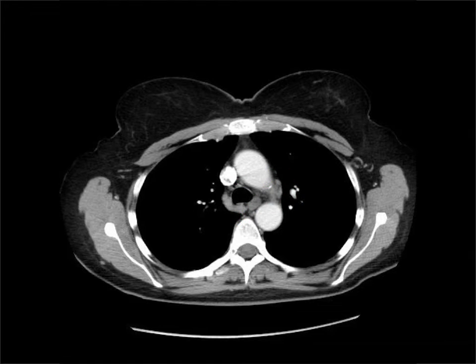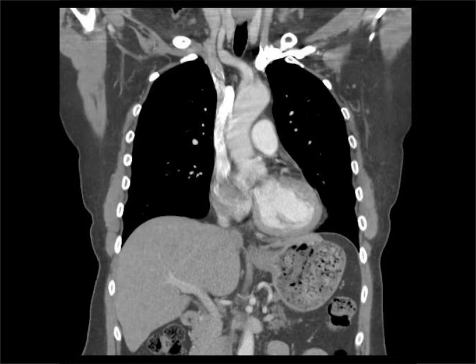Also in the AP window level, just so that we have completeness here, this is the esophagus. This is a normal esophagus, and just to remind you, that was the azygos vein we saw just now. Ascending aorta and descending aorta. What's that vessel going to be? That's going to be the superior vena cava, which we already talked about, and is seen nicely at the level of the azygos. Just to show you on the coronal CT, so we have the aortic knob, we have the main pulmonary artery, there it is, our lovely concave AP window.